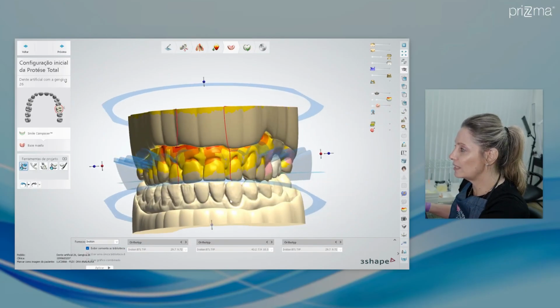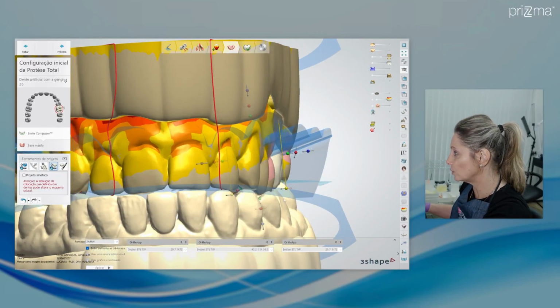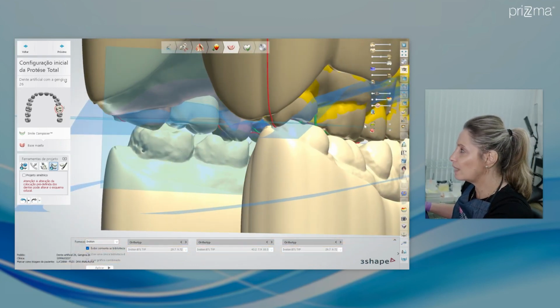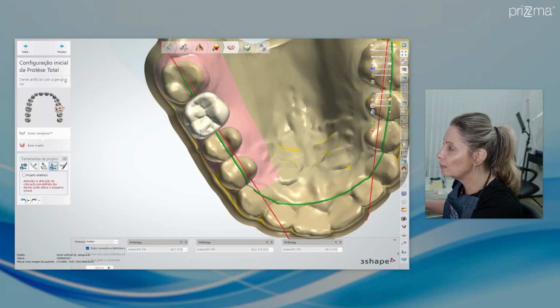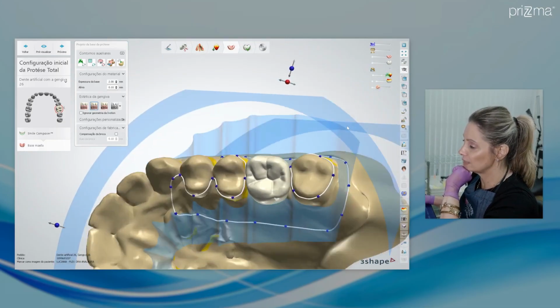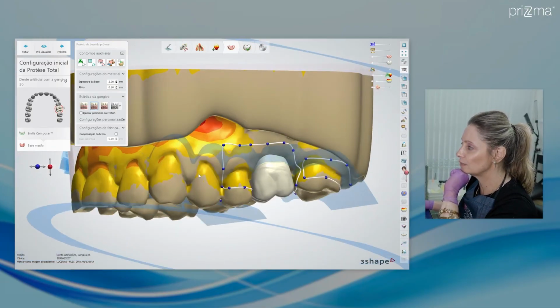So the tooth is already in the correct position, following the alignment. If I want, I can stretch it out a little. I can make it a bit thicker compared to the other teeth, keeping it positioned and well aligned. I always check from the lingual side, the lingual contacts, and eliminate all the interferences or references I have. I always leave the tooth a little smaller with these boundaries very well outlined here now. My clasp for the posterior tooth, the little molar, I leave it. This one is circumferential. We select a circumferential clasp and the palatal limit, always ensuring comfort for the tongue, okay? We can't forget about that.